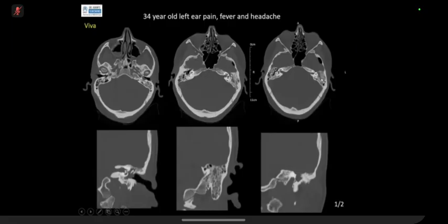What is your conclusion? What has happened, and what will you do next? I believe there is a bony erosion of the ossicular chain, because I can't see the ossicles now. I would like to take this further by having an MR done.